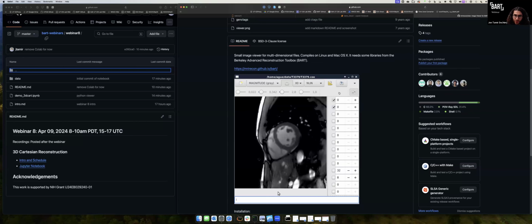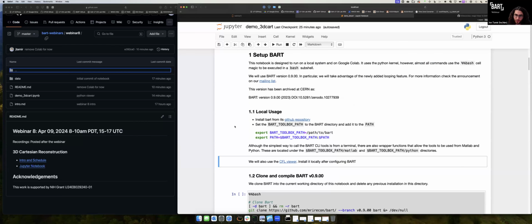And this is a useful viewer when you're working with multidimensional data, because oftentimes you want to change the dimension you're looking at. You want to slice through different indices, index to different slices. And so just plotting a single image or a single slice in Python is not always the best. And I want to emphasize that I think it's really important when you're working with data to just take a look at it and try to understand it before you start processing it a bunch.